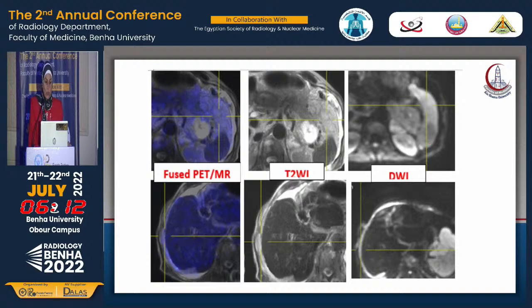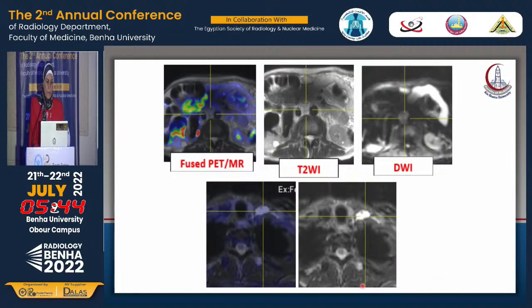the peritoneum as well. And these are the perihepatic peritoneal lesions, which can be easily missed on the CT alone, or the PET component, but on the MRI we can nicely demonstrate this peritoneal deposit, which is precisely evaluated on the diffusion weighted image as a ring of restricted diffusion. And so MRI is very important in these patients for true disease extension.